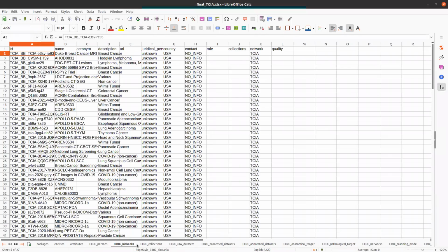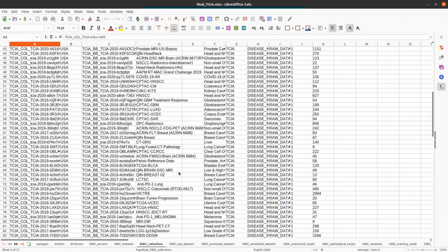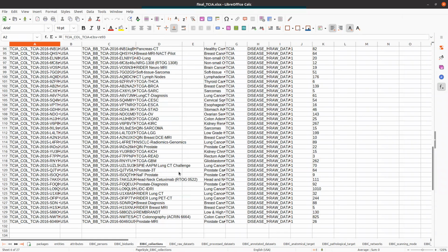And then this is how all the collections and everything is here. The only thing we need to change now is the body parts. We need to check that, we need to change that template. What is it, body parts? Can't find it yet.